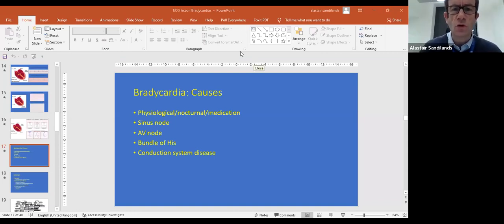Okay, so we'll go through what was the broad QRS signifying in the Brady AF ECG. So that's an escape rhythm. That's the escape rhythm from the distal His-Purkinje system, very broad QRS. Okay, and we're just starting on the causes for bradycardia now.